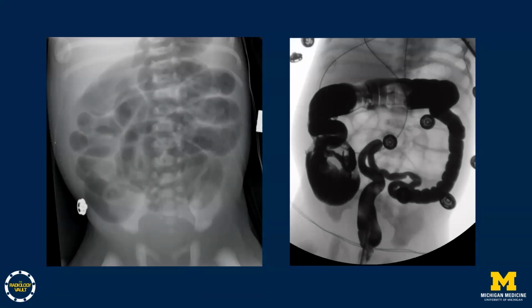In this particular case, we'd be placing the transition zone at the splenic flexure. So since that would be less likely for Hirschsprung disease, since most will be more distal in terms of a transition zone, seeing also that the rectum is more distensible, this would be a nice example and a diagnosis of small left colon syndrome. Again, using the history to help us.